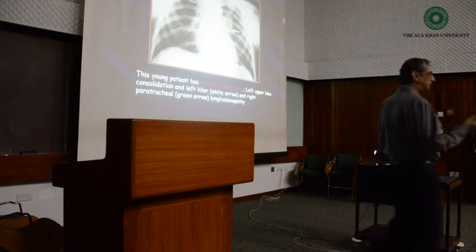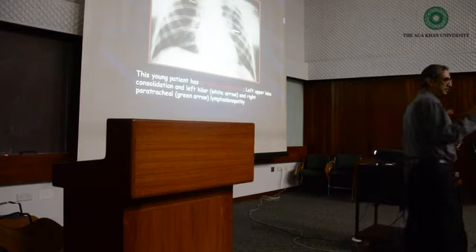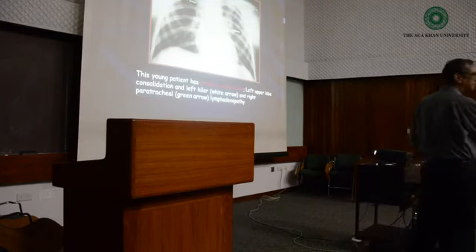A complex is usually more than one thing. So consolidation or pneumonic patch in the lung, a Ghon focus, and along with its lymph node, it's a complex. It is called a primary complex, and it is also called a Ghon complex. Understood? A Ghon focus, primary complex.